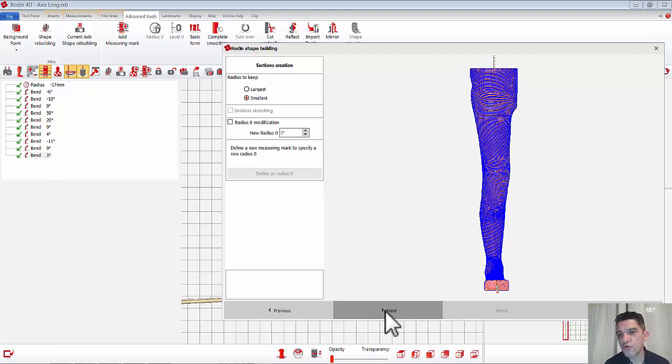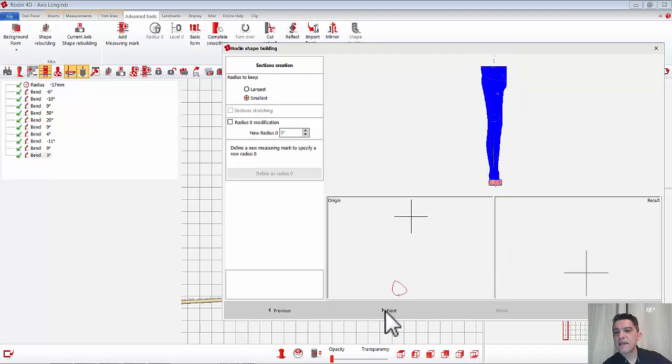This STL file is too heavy, because it's not true that I went to my workshop to scan a positive shape. I import from Neo in Cube, and I start to modify and doing nice things that in Neo is not possible.